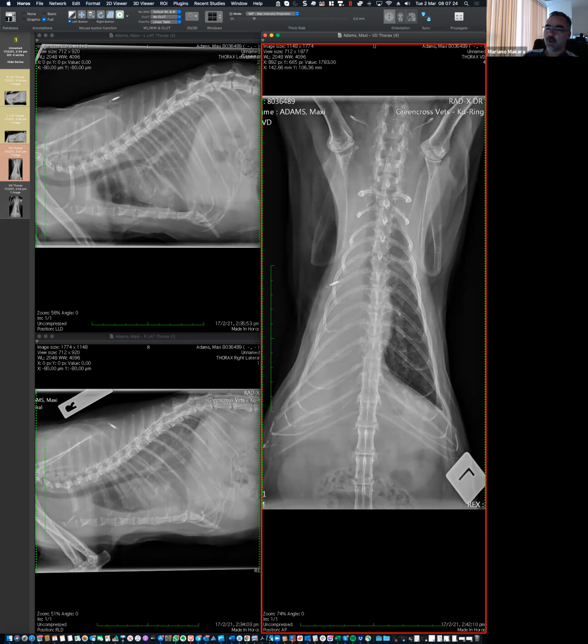I like that statement because that's how I usually approach it. When I don't know, I use exactly the same wording: there is this hemithorax. I'm not giving you more, I'm not telling you exactly, because I don't know. Then I can start arguing, or we can go through and decide what is most likely and why.